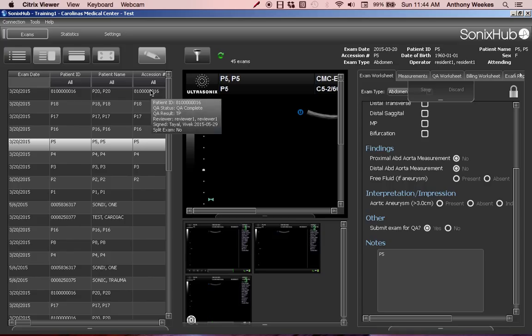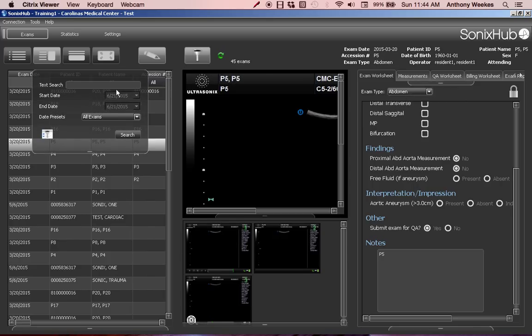And one last thing. This icon is sort of hard to figure out, but I think this is a filter. So you click on it, and then you can search for whatever you want, either by your last name to narrow things down, the resident's last name. You can look for the cardiac exam, and you put cardiac or trauma. You can change the search field. You can look at the range of dates, whether it's last month, because you're really not sure how long, and then you can put in cardiac.